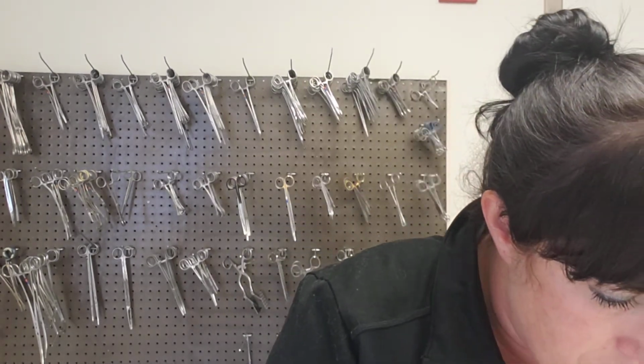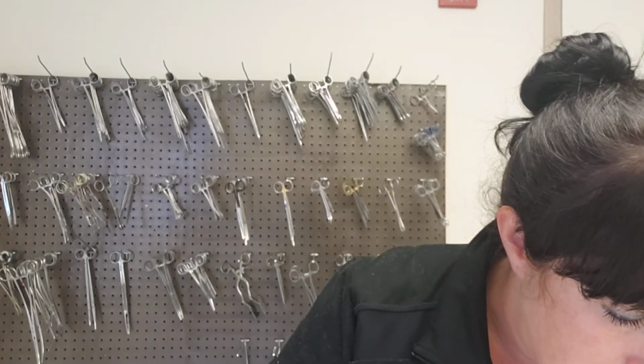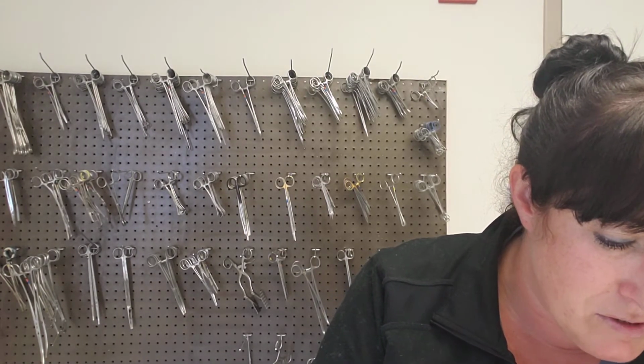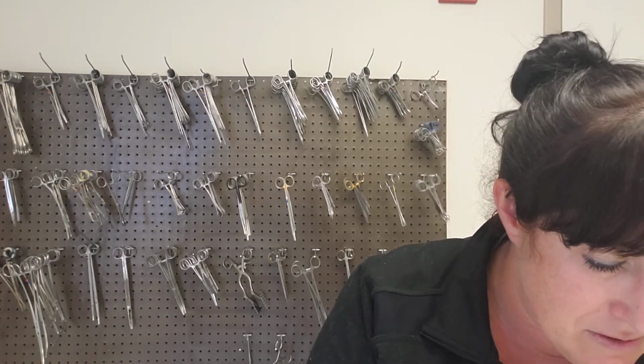And let's see if there's any more worth mentioning. There are also urethral dilators, and you do use a different one for the female versus what you would use for the male. And the female ones are shorter than the Van Buren urethral dilators for men. I don't have any of those to show you, but believe me, you're going to see them at the clinical site.